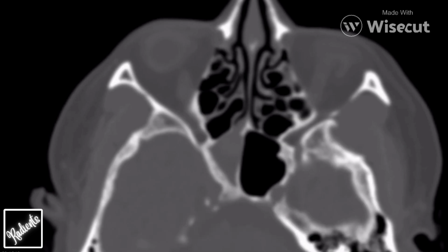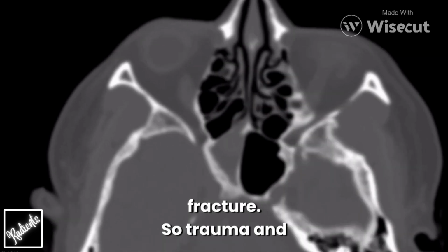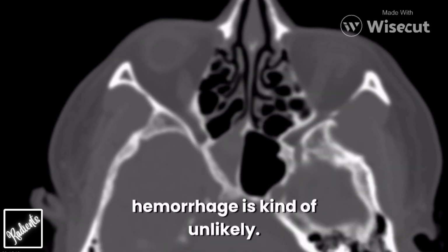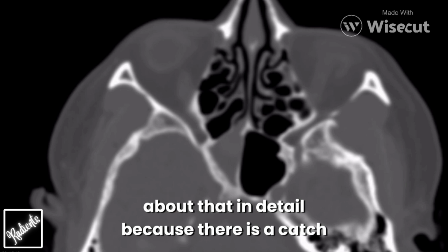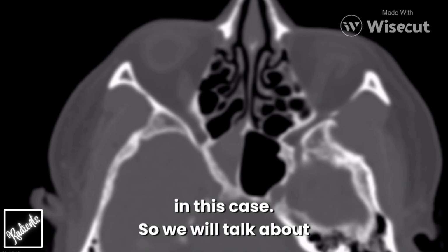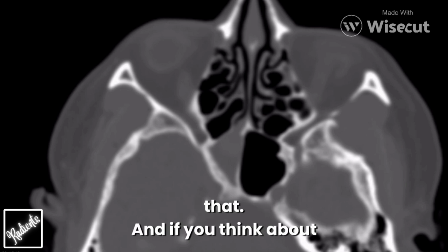And what am I talking about? You don't find fracture, so trauma and hemorrhage is kind of unlikely. Yes, this can be chronic inspissated secretion, as I said, but we will be talking about that in detail because there is a catch in this case. So we will talk about that.